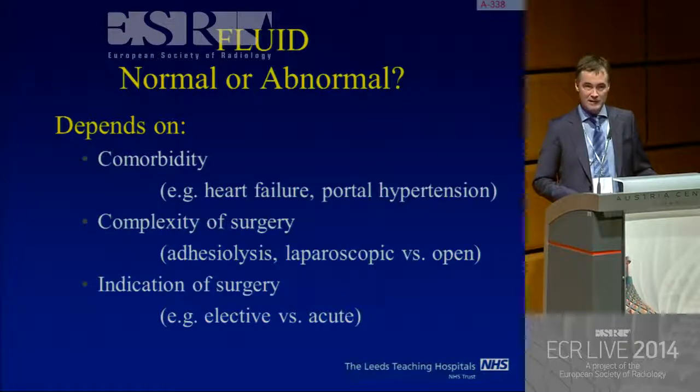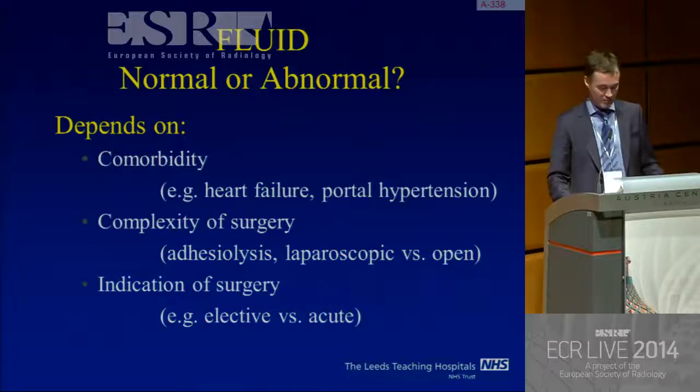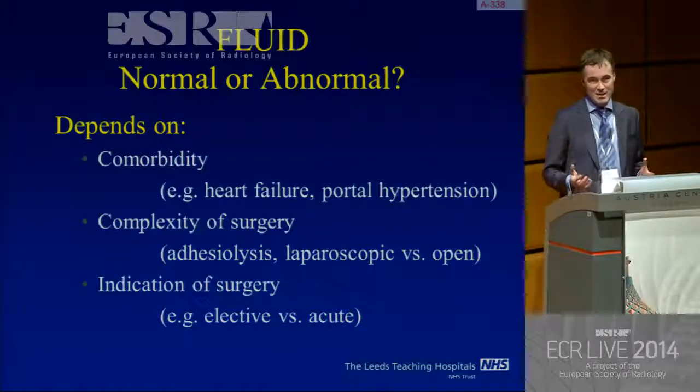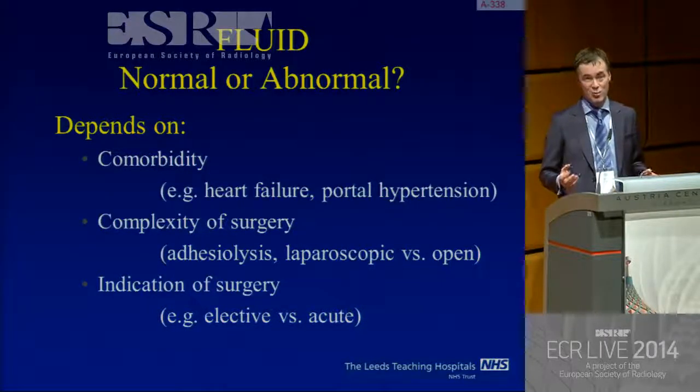Now, fluid. Fluid is very difficult sometimes, particularly in patients who've got comorbidities like heart failure or portal hypertension. Remember that the amount of fluid that you would expect to see will change depending on what has actually happened to the patient during their operation.